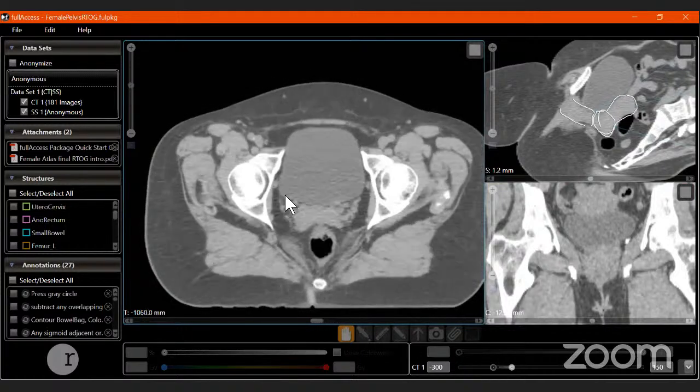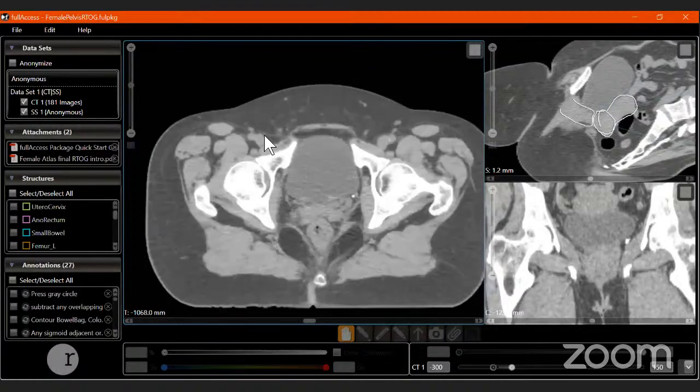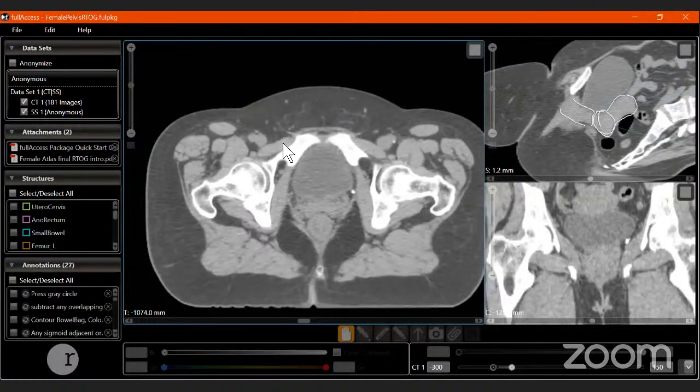This is the femur head, and this is where the femoral artery is. The lateral border is going to be the sartorius edge. This is the sartorius muscle. The medial part of the sartorius edge will be the lateral part of the inguinal region. For the inguinal volume, the medial part will come as far as you can up to the bone and the muscle. The medial muscles here are adductor longus and adductor magnus.